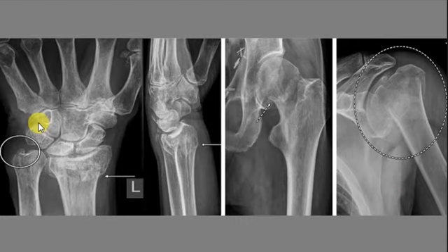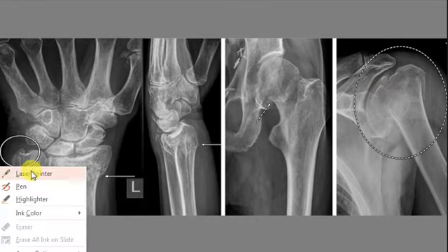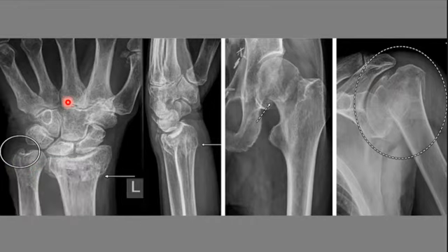Here we have some examples of osteoporotic fractures. I think the most common ones occur in the vertebral body and in the femur, such as you see here, subcapital fracture. We see this Colles fracture and humeral fracture. As we see, there is decreased bone density. That's why they say osteoporotic fractures occur after mild trauma.